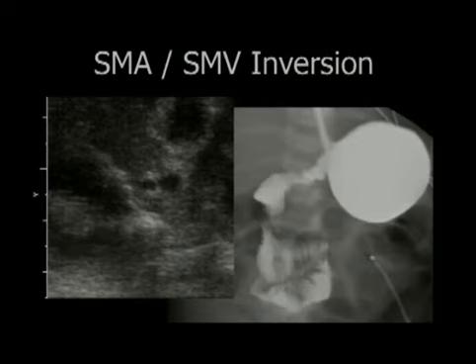And sure enough, when we take this child over to fluoroscopy, the duodenal C-loop, instead of coming up to this level, which would be normal rotation, it's much too low. You can even see there's a little bit of bowel dilatation in this child with malrotation and intermittent volvulus.